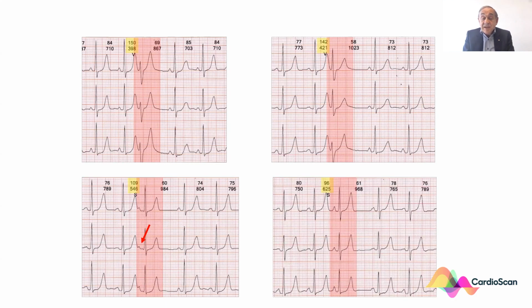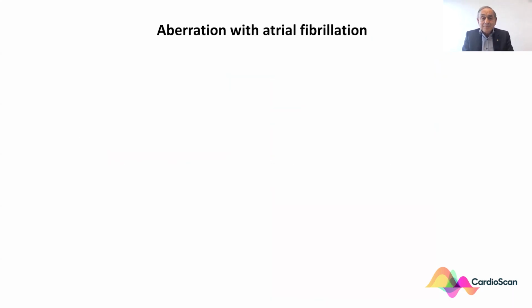Later still, and this is very obviously an atrial ectopic. So we can't always tell on looking at one QRS complex whether this is aberration or not, but we have learnt now to look at other complexes to see, as they often do occur later, and will declare what they are.